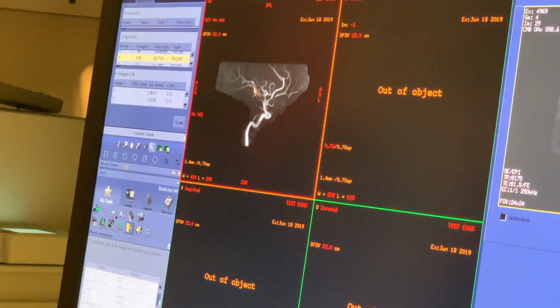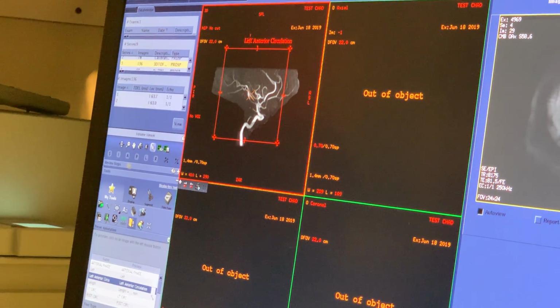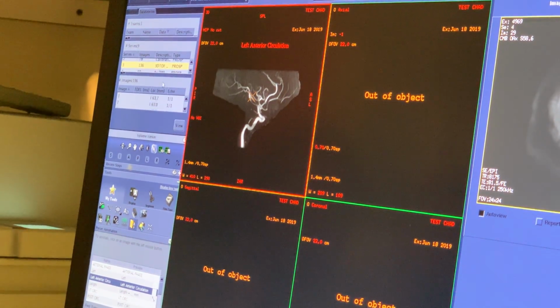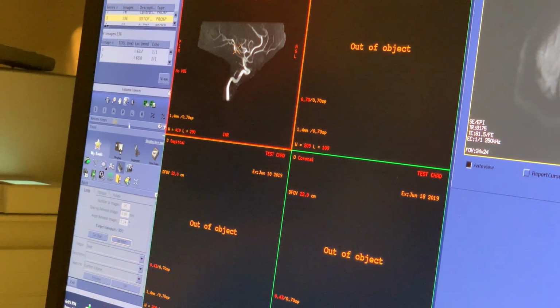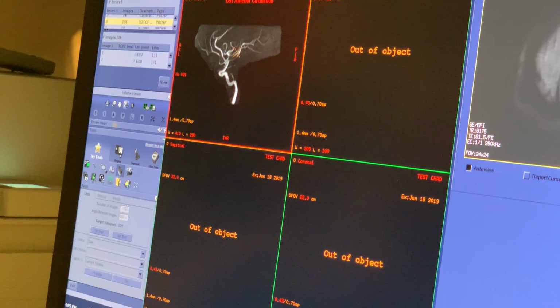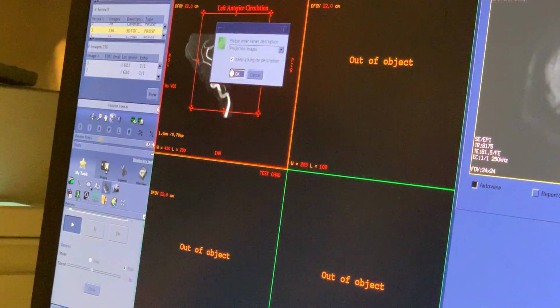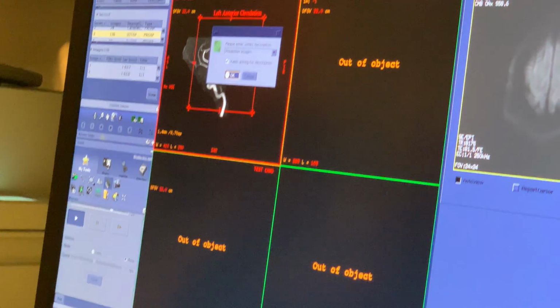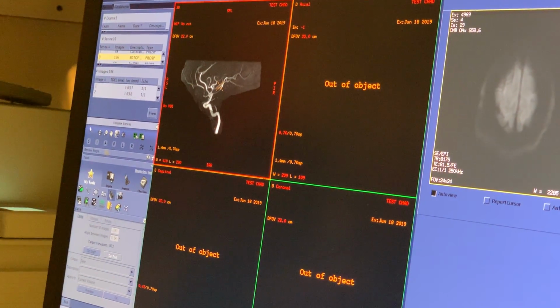We're looking at the left side now. So left anterior circulation, boom. Good. All right, and then I come back here. I start it, left, end, and then 36. Click OK, and OK. All right, we're in the home stretch, which is good because I'm getting bored of it already.